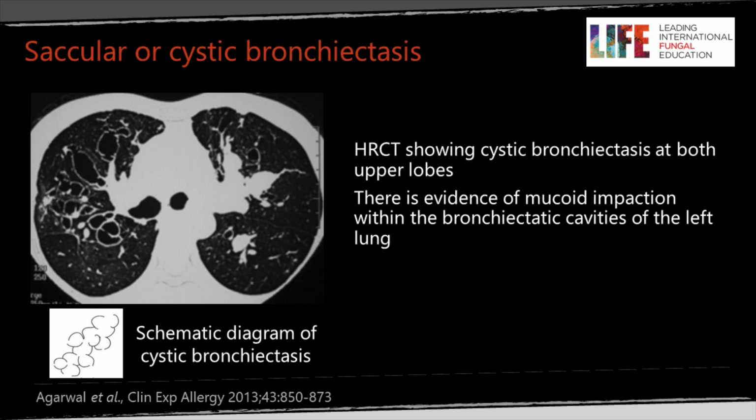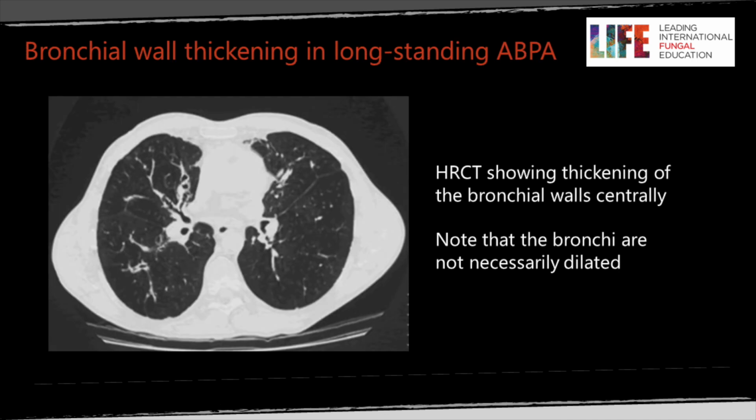If the mucus plug stays in place, secretions carry on building up in the metabolically active lung, which just isn't aerated, and the bronchi get bigger and bigger. Sometimes the actual plugging isn't the major feature, but the degree of inflammation within the wall is very striking. And here you can appreciate the bronchial wall is several times normal. It should be hardly possible to see the bronchial wall. You can't really appreciate it other than just the merest white in the left lung, but on the right it's grossly thickened.